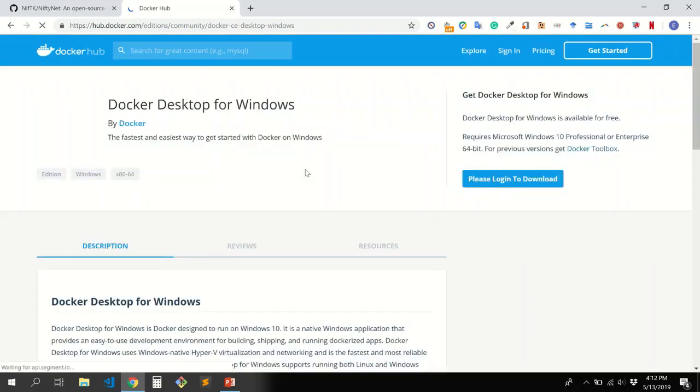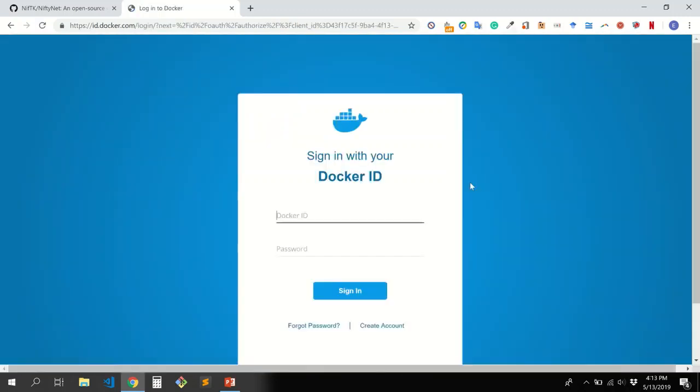The Docker Hub Registry is the web page where you have the different images to be executed. You need to sign up on the Docker web page in order to download, push, and pull the images there.